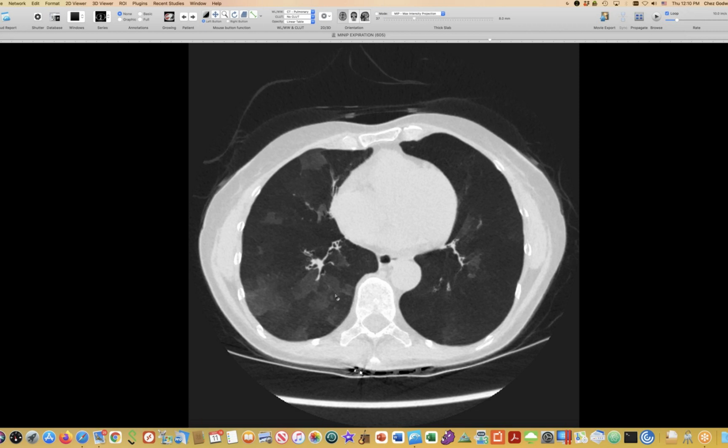So the reason that her diaphragm fluoro was abnormal is because her lungs are permanently hyperinflated. She can't exhale very well, and that's why there wasn't very much excursion of the diaphragm. And then the cause of this constrictive bronchiolitis is probably her rheumatoid arthritis. That's what our pulmonologists consider. So she's a lung transplant candidate.